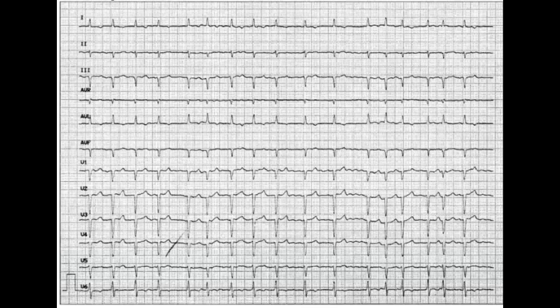Second of all, action is irregular. Rhythm, here, you don't see clear P waves before each QRS complexes in lead 1 and lead 2. So it's non-sinus rhythm. We'll figure out what it is later. And the frequency, I don't know if you can calculate it, but like, okay, 1, 2, 3, 4, 5, 6, 7, 8, 9, 10, 11, 12, 13, 14, 15, 16, 17. So 17 times 6, so it's 102.